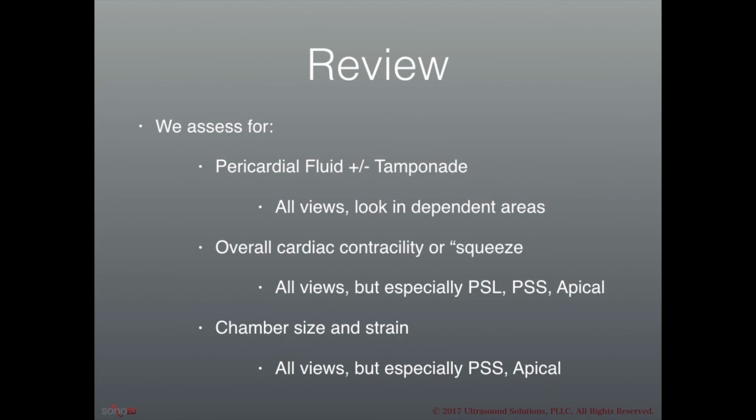Ask yourself about the squeeze of the heart. Are there any issues with the contractility? Is it hypokinetic or is it hyperdynamic? Look at the left ventricle in all views before making this call. And lastly, assess for acute right heart strain, which is best seen in the parasternal short view or the apical 4-chamber view.